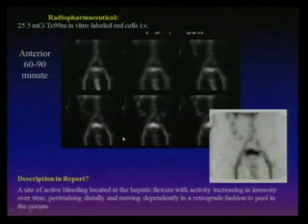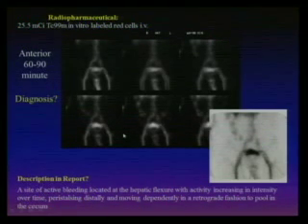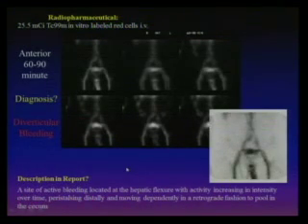So this is just, you see some extravasation and then you follow it and see either antegrade or retrograde. And when you see it moving, that's the best sign, it has to be bleeding. Sometimes it's too small, but I never saw that. If you see something that looks abnormal but never moves, it's probably not bleeding. Like a prominent vessel or something else, sometimes a tumor or metastasis, anything. But bleeding has to move.